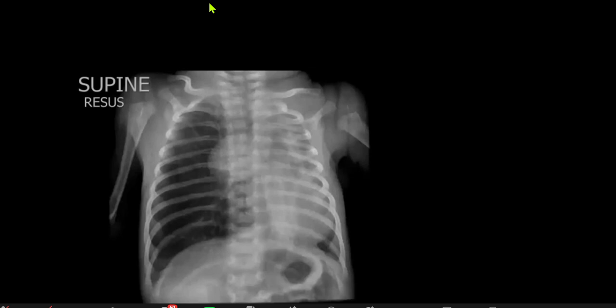There appears to be a degree of leftwards mediastinal shift, as this is a fairly centered radiograph. As far as I can see, the right lung looks quite normal, and therefore I think that the primary pathology lies on the left rather than overinflation on the right. I'd be concerned for either plugging of one of the left main or lobar bronchi, or bronchial atresia.